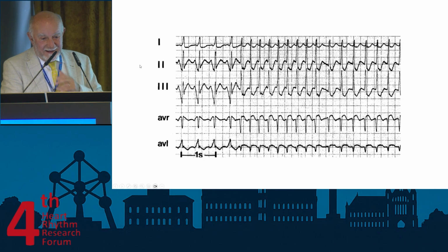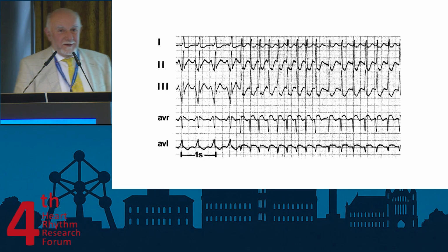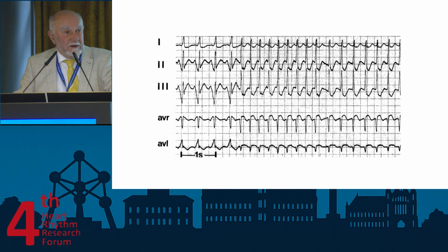Okay, so what do we see here? Look, with these huge Q waves in 2 and 3. What is that? Is that an inferior infarction with junctional accelerated rhythm?